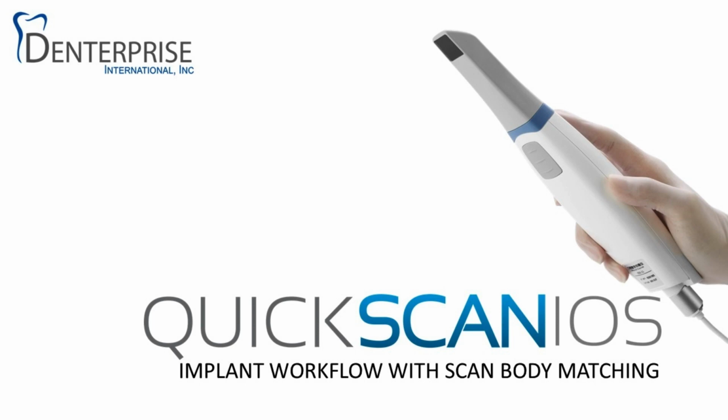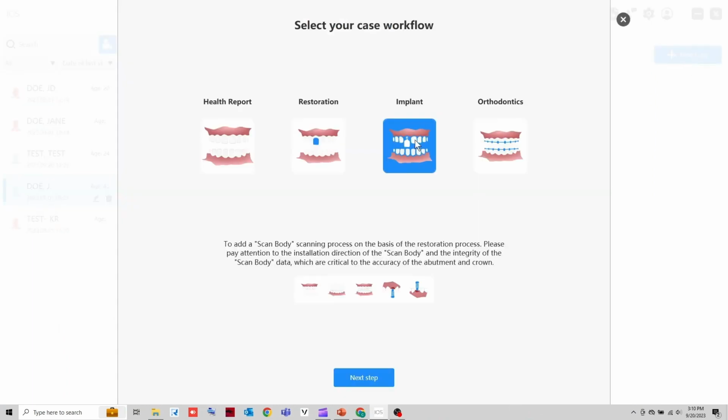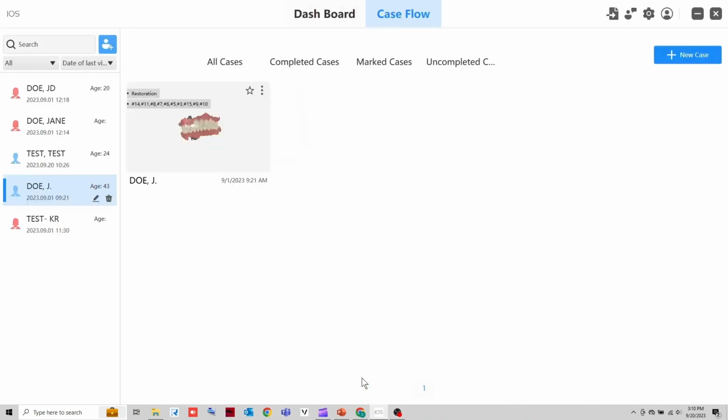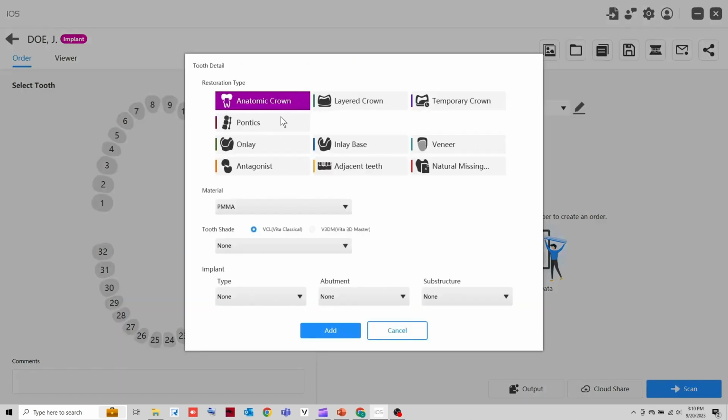In this video, I'll walk you through the implant workflow. Create a new case and choose the implant workflow. Identify the tooth where the implants are placed. Fill in the prescription accordingly.